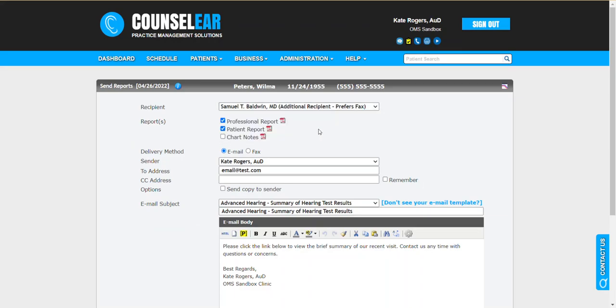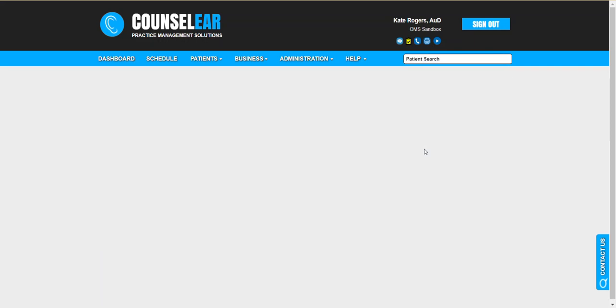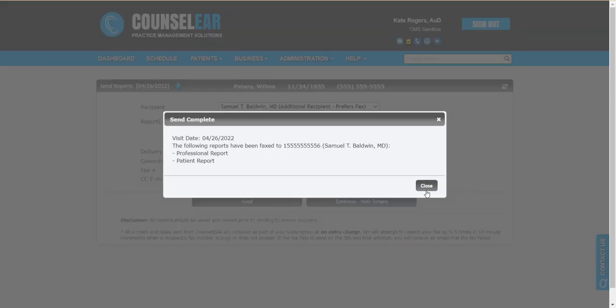All right, well, let's send this out to Dr. Baldwin. Great. So now we have noted that he prefers faxing. So we'll change this over to fax. It fills in his fax number. We're going to send both the professional and patient report via fax. We click send, and now that fax is out the door, right?